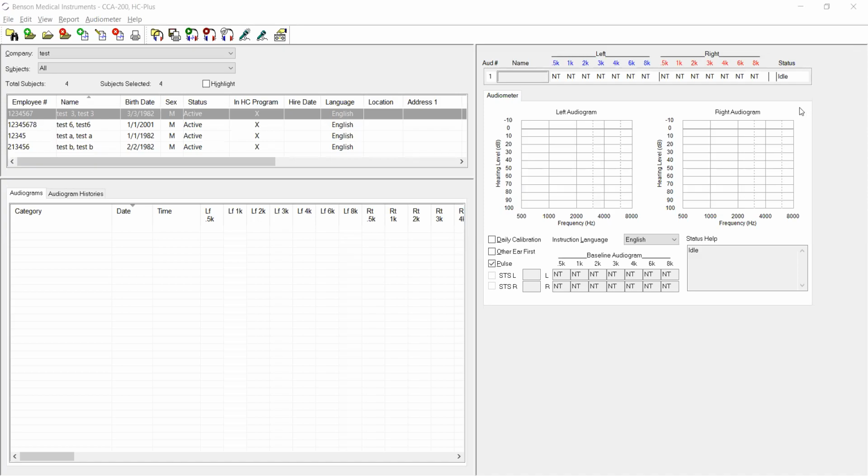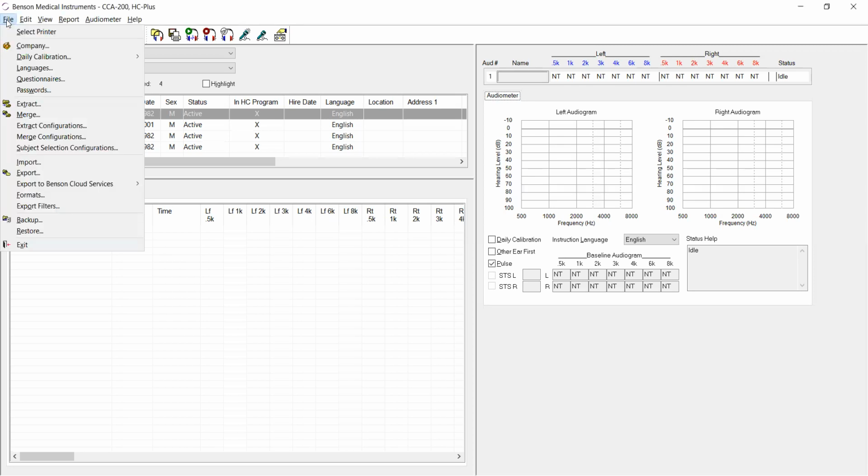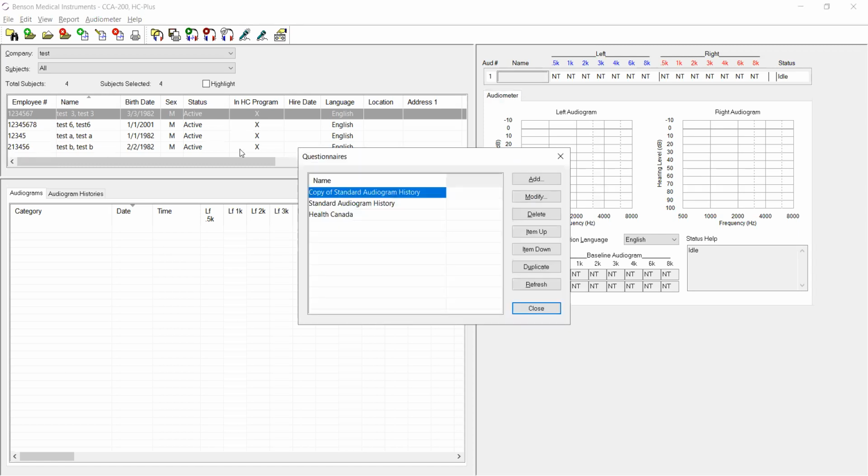In this particular section of the CCA 200 mini training video, we're going to look into creating custom questionnaires. Having said that, we click on the File menu button. From there, we can scroll down to Questionnaires. Currently, you'll see on my device, we have 3 questionnaires listed.